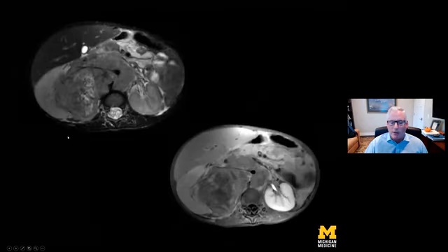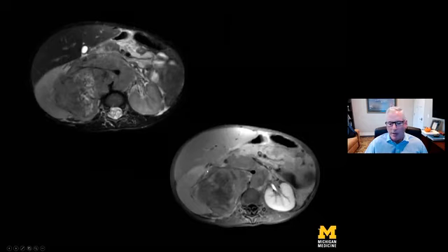And again, we have a very large retroperitoneal mass. We see not only encasement, the elevation of the aorta off of the spine, encasement of the right renal artery, mass effect on the kidney such that there is an obstructed nephrogram compared to the normal left kidney. We see how we cross midline, and as that tumor extended superiorly, that's what gave us that widened left paraspinal line from retrocrural metastatic adenopathy or extension of tumor directly.